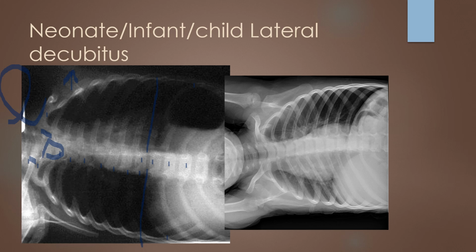Positioning is not horrible. They are really close to clipping the side down. So maybe put that patient on a sponge, add your markers, correct your technique, and then position relatively closely, but watch that mid-coronal plane a little bit. This image, you can see, I'm not going to go over the whole thing. I'm just going to let you look at it and practice your technique on there.